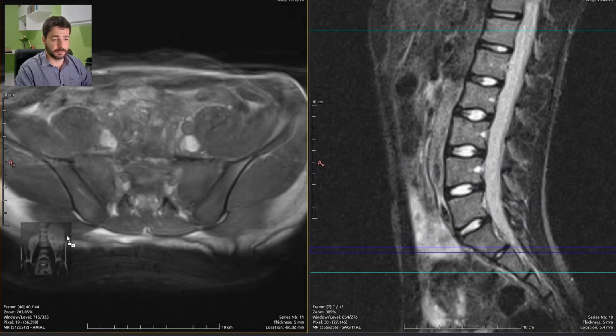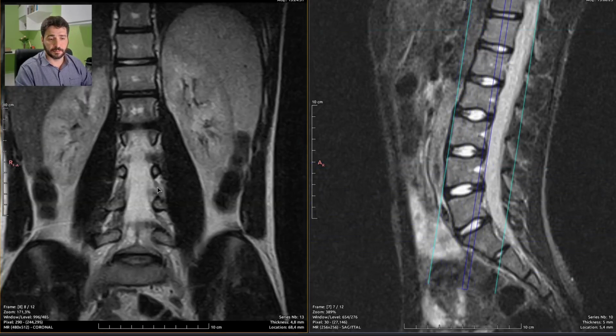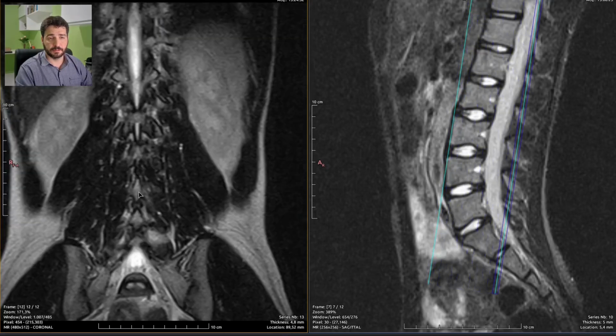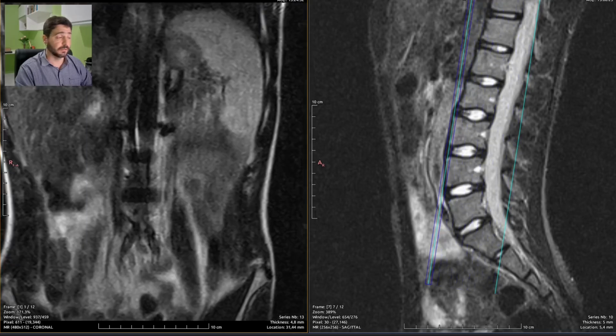This looks like an easy one. There is even a coronal plane image, which is nice to look at and kinda useless to report.